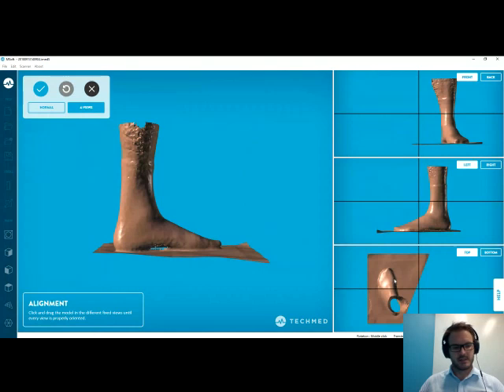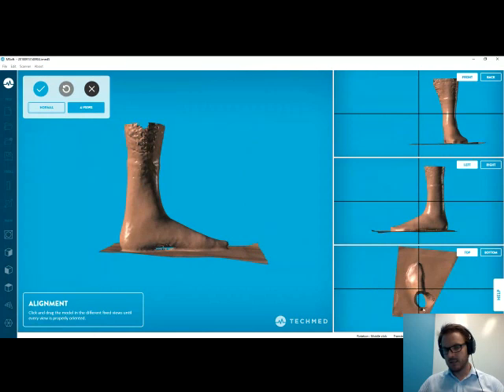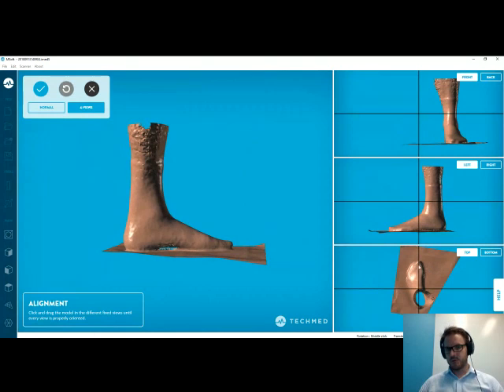So if we press Control and the middle button on the mouse, and we keep these buttons pushed, we can drag the image in the middle so that we can do the alignment between the heel and approximately between the two first toes. And here is fine, the front is fine as well. So we're all set here.